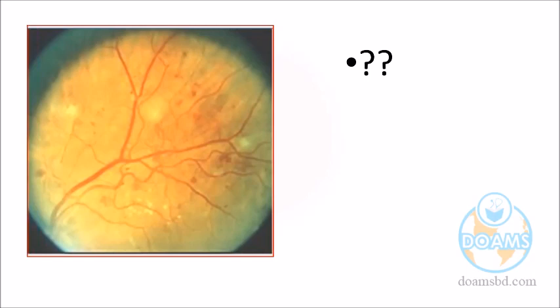Hypertensive retinopathy. Why are you telling that? Is there any silver wiring, copper wiring? Sir, there is a cotton wool spot. And also flame hemorrhage. Flame hemorrhage? No, these are blot hemorrhages. Dot hemorrhage. Dot and blot. Yes. Any other observations in the retina?